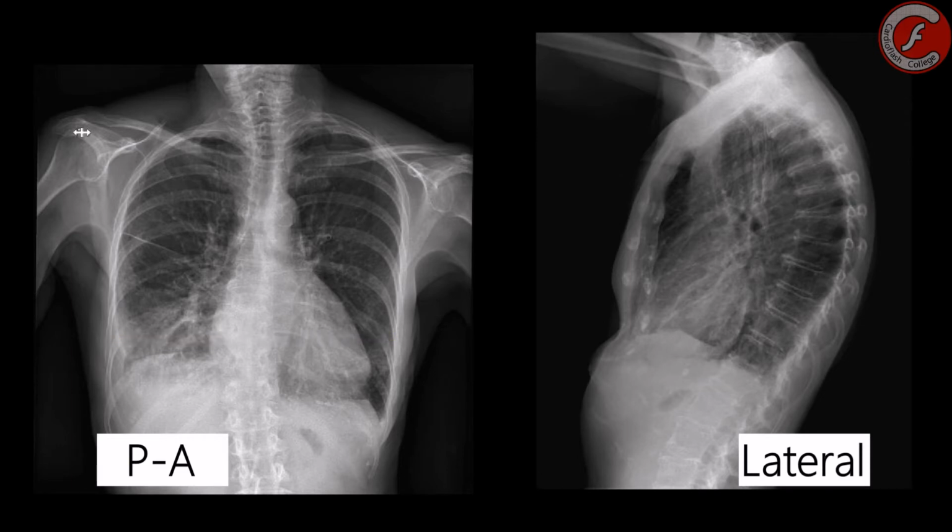In this case, it seems probable that the left cavities are dilated because there are radiological data that suggest so. These are, for example, the convexity of the left edge of the heart shape and the proximity of the posterior edge of the left ventricle with regard to the spinal column.